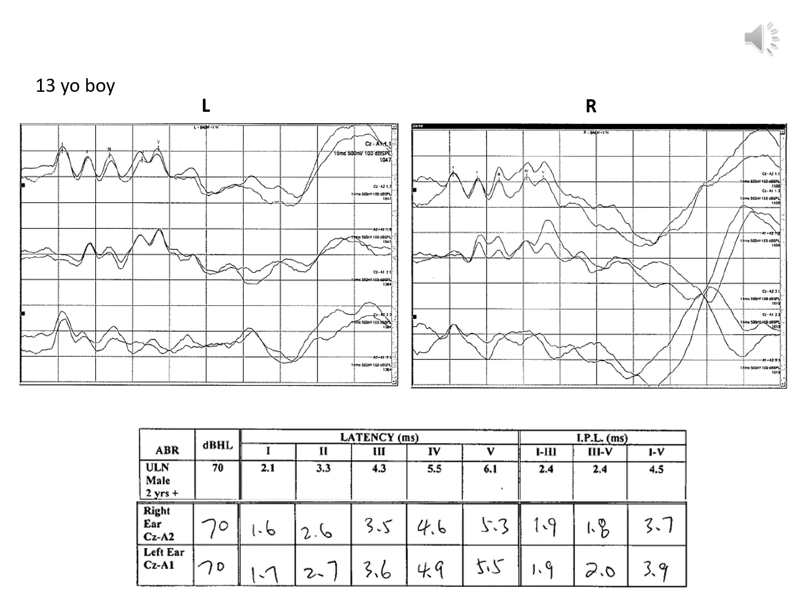Now, in the middle tracings for both of them, when you look at the contralateral ear relative to CZ, the waveform that is most prominent is the wave 5. And so you will see in both cases, the wave 5 is very clear, as well as the wave 4, 3, and 2. Moving down to the bottom tracing in each panel, this is the ipsilateral ear relative to contralateral ear. The waveform that is most clear is the wave 1, and so we see that in all of these cases.